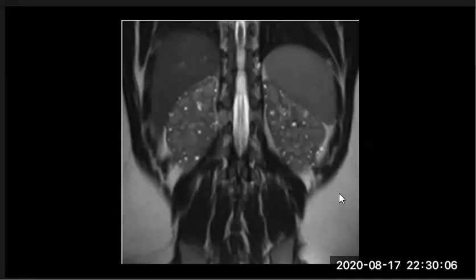How to differentiate it from chronic renal disease? In chronic renal disease, there is associated parenchymal atrophy, the kidney is atrophied. Here with lithium-induced nephrotoxicity, the kidney size is normal. In chronic disease the kidney size is abnormal, it is small, and the cysts differ in sizes. Here the cysts are, as you said, uniformly distributed.